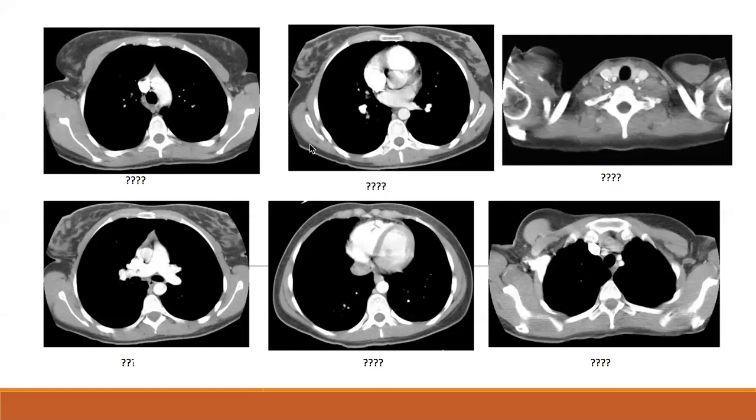And then at the level of the atria, which is sort of like the top level of the heart, you're going to have the right ventricle, which you can tell because it's the one that is the most anterior. You're going to have your right atrium, your left atrium. And then we can start following these three different structures, which are your descending aorta, your azygos, and your esophagus. So moving down to the level of the ventricle, you can see those same structures again.